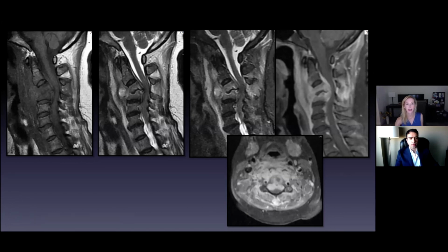Can you draw at the posterior aspect of C2, the posterior vertebral body, to the lamina, just a straight horizontal line from the posterior aspect of C2 to the base of the lamina, somewhere right above the disc? Just right about there. On the T2 image? Exactly. Perfect.